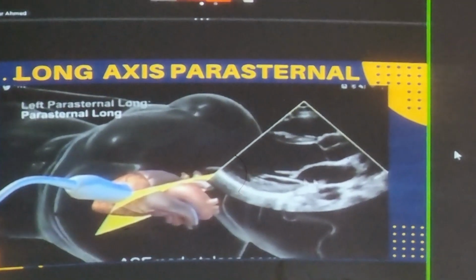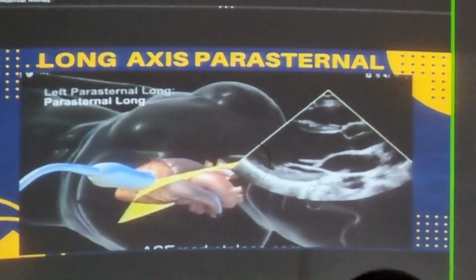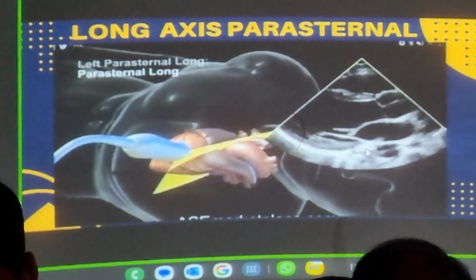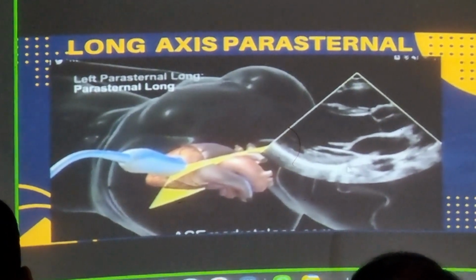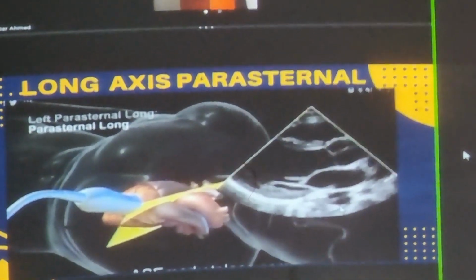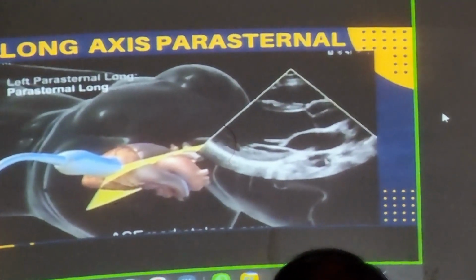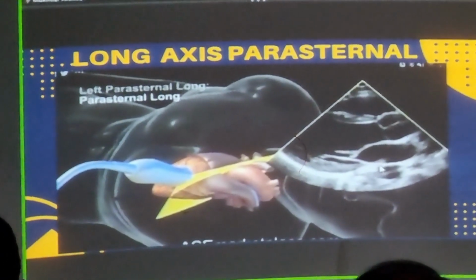So you can find aortic dissection in the thorax by just looking at this image, which will be focusing on the aortic ascent and aortic descent over here. This is very important from an exam point of view as well. They will show you the image, which is a long axis view, and they will show you a pericardial effusion somewhere around here, the pericardium, and they will ask whether it's a pericardial effusion or a pleural effusion.